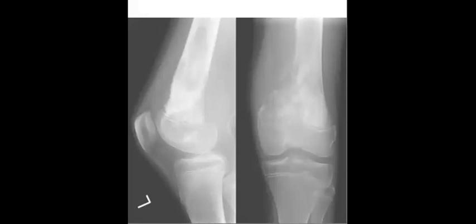Let's go to this one. Yeah, melanoma, lung. Perfect, Marwa. Again, the same wide zone. Yeah, nice, wide zone of transition. So your first impression, it is an aggressive lesion. The location here is very important to mention: it is metadiaphyseal. There is cortical breaching and cortical erosion.